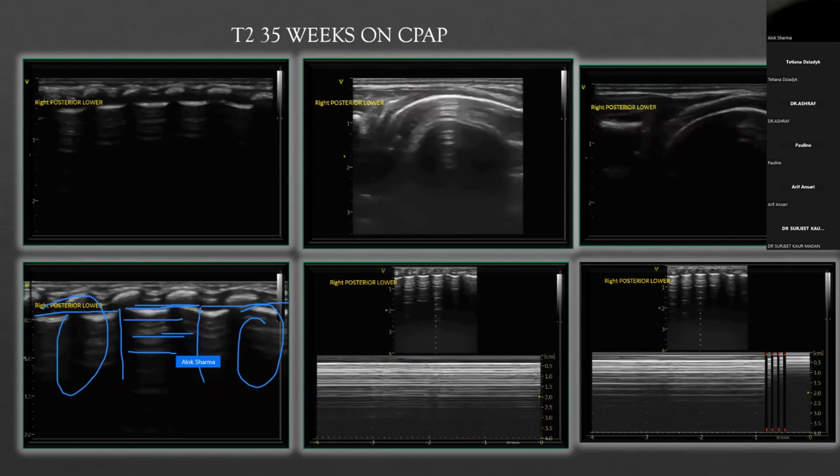Now, the other thing that is why I think this is a pseudo barcode sign or an artifact is I cannot see seashore sign anywhere in this region and anywhere in this region. So this is not even a bubble. If we say that there's a small area, then really what we should see is seashore sign with a barcode in between.